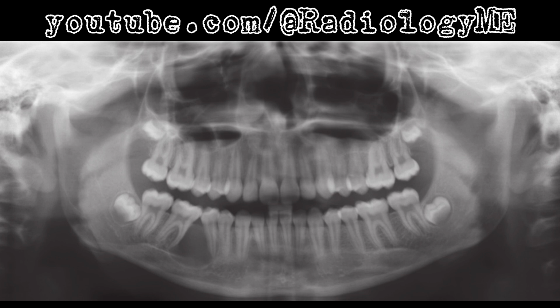Now, in a case like this, the differential diagnosis typically narrows down to 2 main contenders: keratocystic odontogenic tumor, KCOT, and ameloblastoma. Given that the lesion is unilocular and located in an area associated with tooth development, KCOT is the most likely diagnosis, especially in a young patient like this. KCOTs are well corticated, expansile, and have a high recurrence rate if not thoroughly treated. Ameloblastomas, while also possible, tend to be more aggressive, often causing root resorption, which we don't see here.